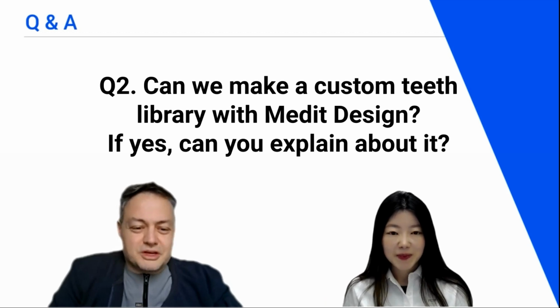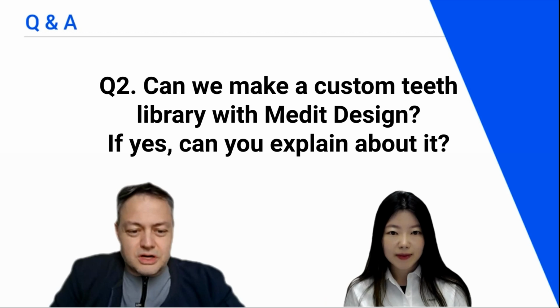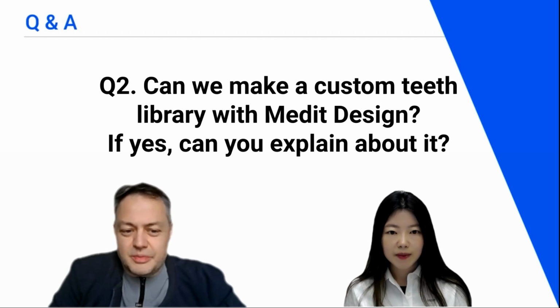Yeah, so my workflow here is to actually go to ExoCAD and plan a full arch of teeth, and I'm using their full anatomic libraries, any library I need, and I just put it outside the arch. Then I export every tooth from the library and bring it in Medit Design.